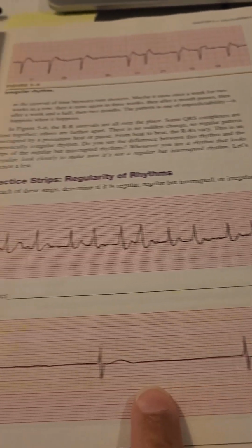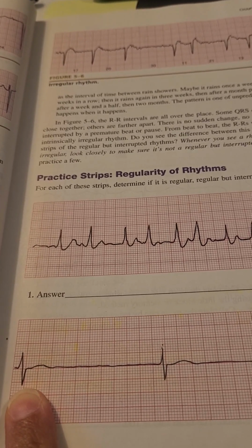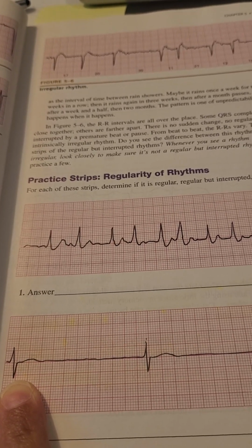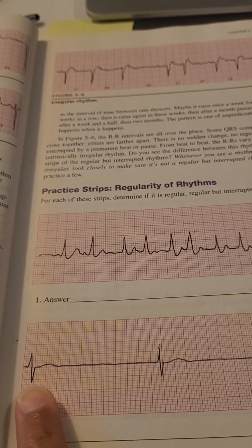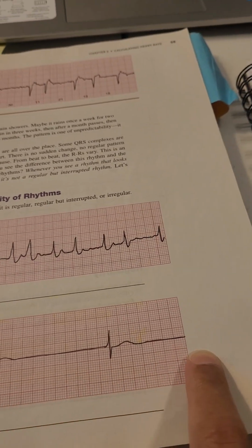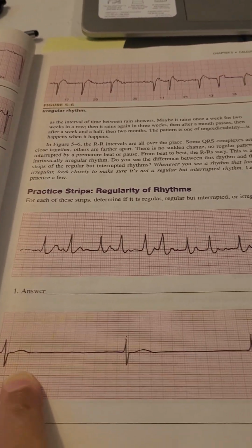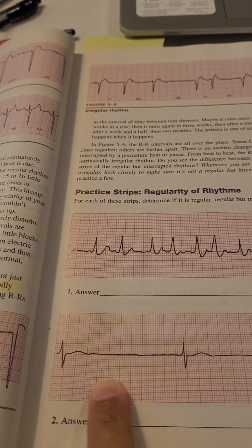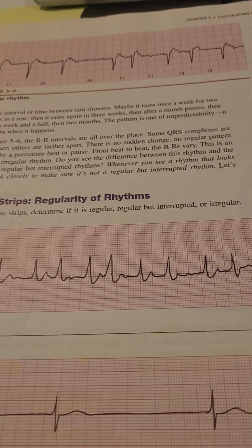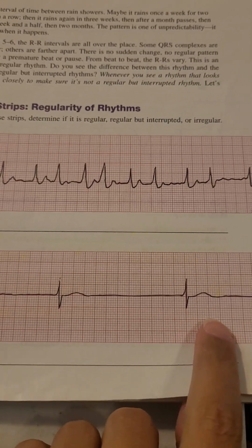This one's kind of scary, because a good healthy heart is supposed to be beating 60 to 100 times a minute. And like we said, within this 6 second strip, there should at least be six heartbeats on here, but we only see three. So that's something dangerous right there. If they don't take care of this, it's only going to get worse, right?